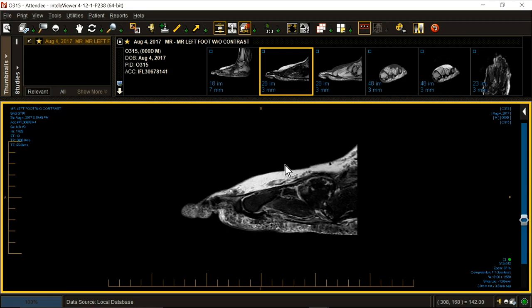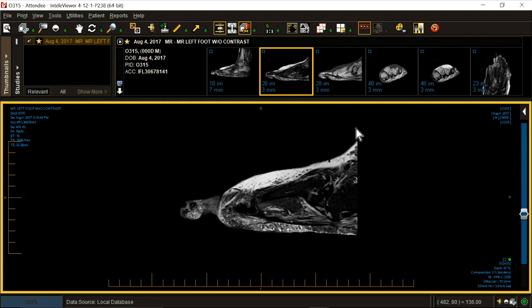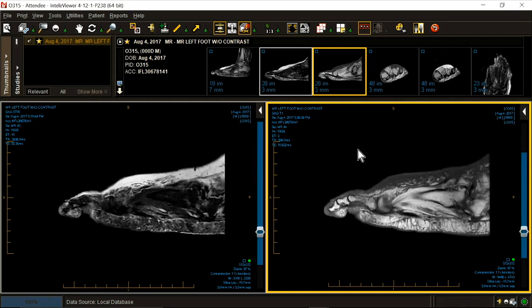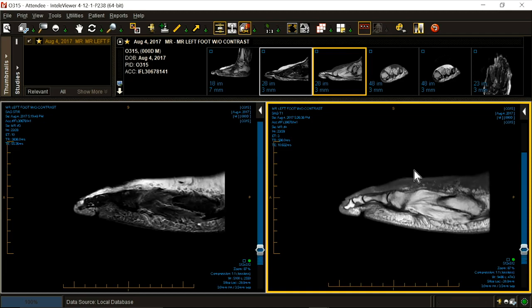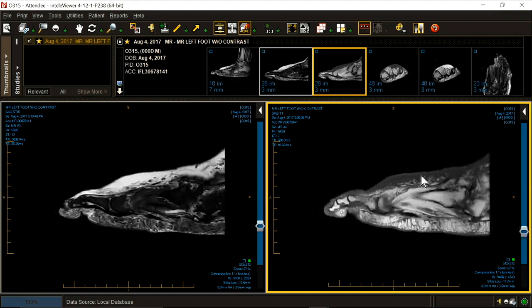82-year-old man with non-pressure ulcer, lateral 5th digit. Swollen foot, sagittal. Let's go to the pinky toe. This one's a little tougher.